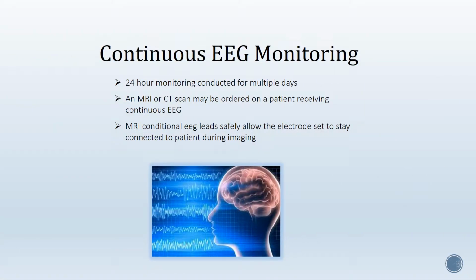Continuous EEG monitoring is frequently conducted for multiple days. If an MRI or CAT scan is ordered on a patient receiving continuous EEG, MR conditional leads safely allow the electrodes to stay connected to the patient during imaging.